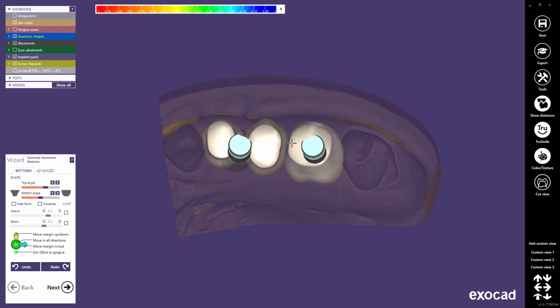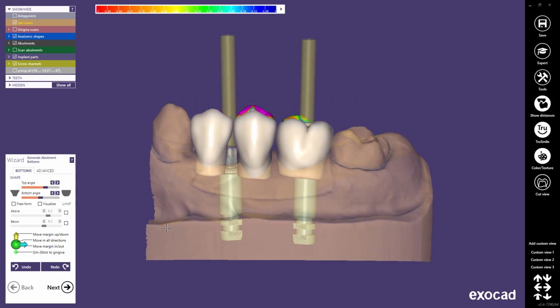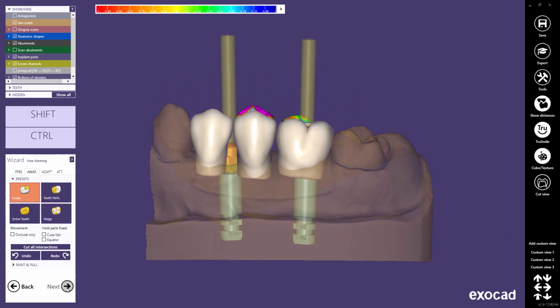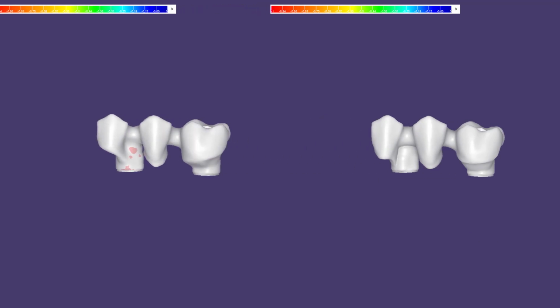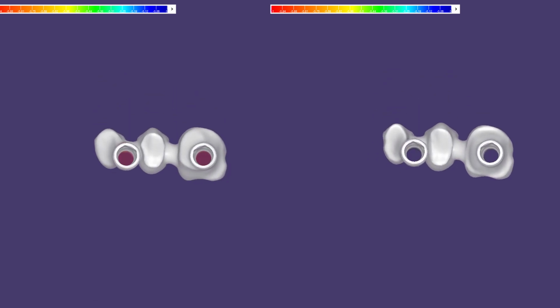You can see that closed pontics are loaded. You notice that after the tooth placement, the software will create the minimum thickness around the die or implant and keep the exact shape of the tooth library. Let's compare these options for a screw-retained bridge. Please note, the digital waxup feature is still available and can still be selected as an option in the anatomic or reduced waxup reconstruction type.